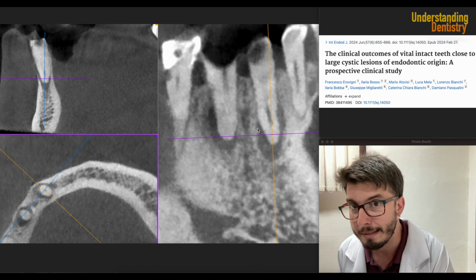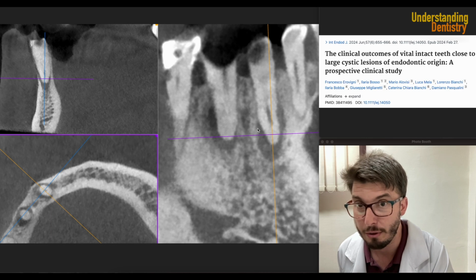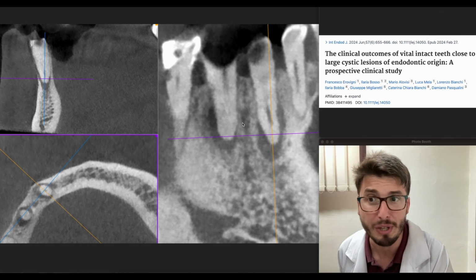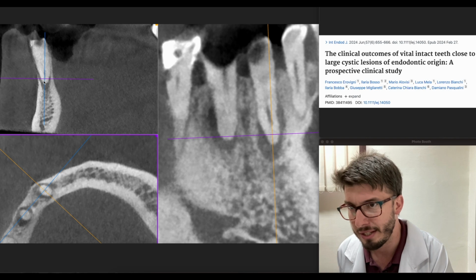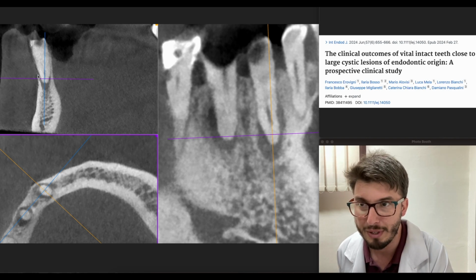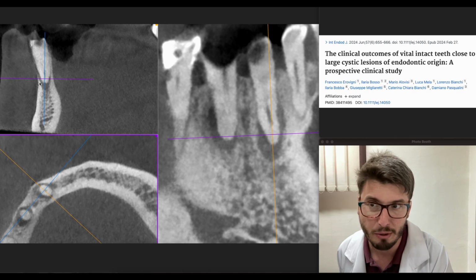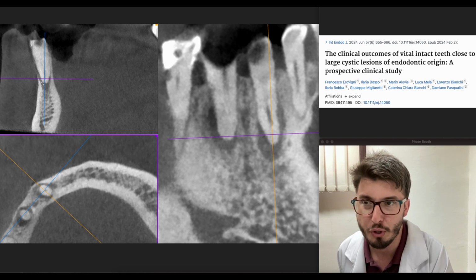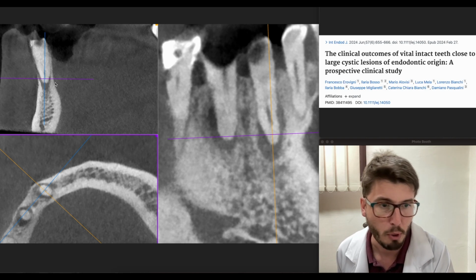It's actually a little too big for a granuloma regarding the extension, especially here, but they could also be periapical granulomas. Now, if we assess this cross-sectional image, because it's oblique, we are seeing that it's almost an endoperio lesion, because the periapical lesion is almost in continuation with the bone loss here, with the buccal bone defect.